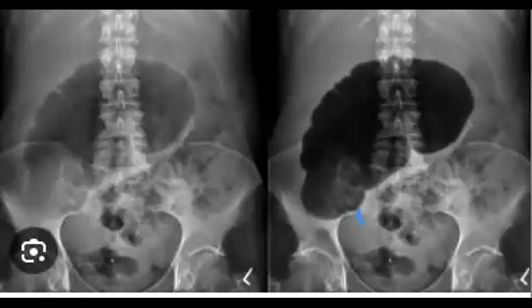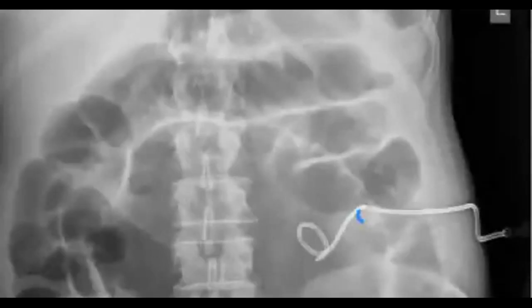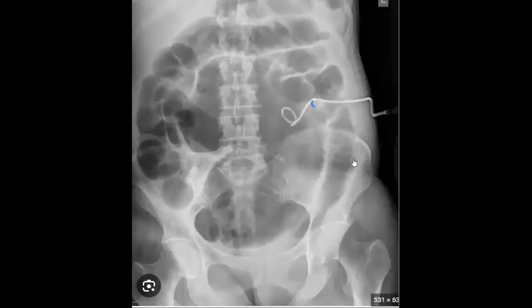Usually the cecal volvulus is in a younger age group and pointing in the left upper quadrant. And the most important, to be honest, is to go check for the cecal and also go check for the subsequent process, what will happen. Like you know that in the cecal volvulus, there will be dilated small bowel loops as a subsequent process.